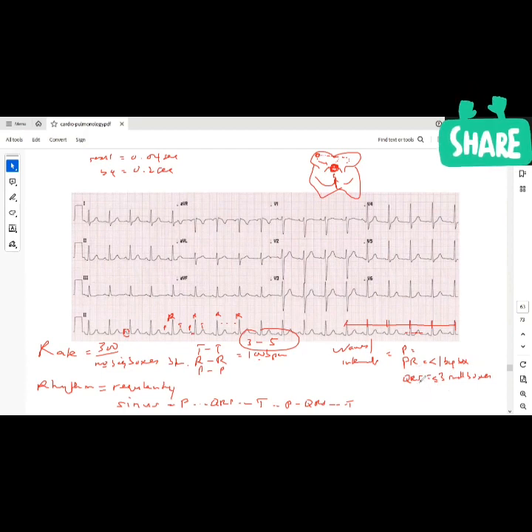And then PR, QRS, and then you look for your QT interval. The QT interval, I usually put that at about 2 big boxes approximately. So anything longer than that typically means a prolonged QT interval. Remember our antiarrhythmics that block potassium channels, that block phase 3, they can do this. Someone can also have congenital long QT syndrome due to a mutation in potassium channels or sodium channels, things like that.